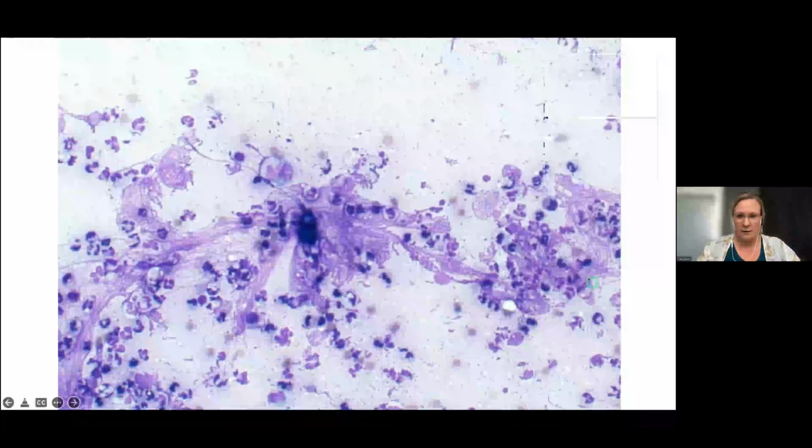And when we're getting a little bit closer so that we can see all the cell morphology a bit better, first of all, again, ignore all of this streaming purple, blown up cellular material. All of that is just nuclear debris. But you can see, again, all of these inflammatory cells all over the place, which are mostly neutrophils. And we've also got some macrophages stuck in there as well, but primarily neutrophils all over. And then what you might notice, hopefully, right there in the center, there's a really dark blue blob. And we really want to see that closer to see what that might be.